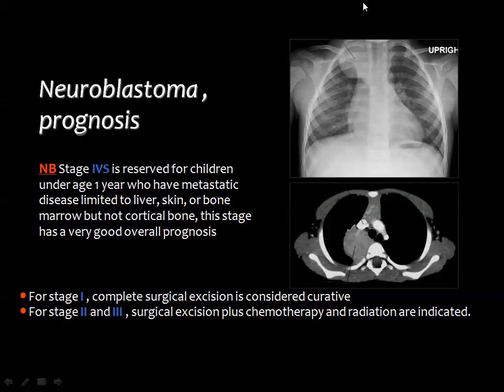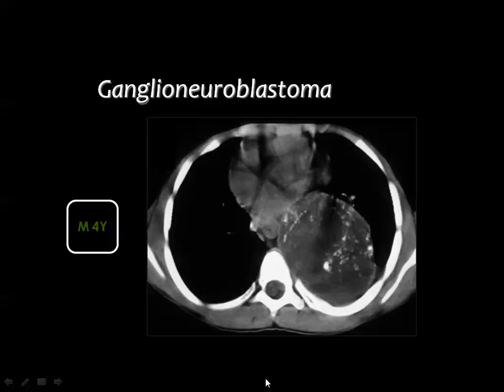This is another example of neuroblastoma in the posterior part of the superior mediastinum. The ganglioneuroblastoma is some maturation of the neuroblastoma into ganglioneuroblastoma. Here we see a mass showing the criteria of neuroblastoma, being posteriorly located, containing calcium in the paravertebral gutter. The age of the patient is 4 years, suggestive that this may be a ganglioneuroblastoma, but is not conclusive.